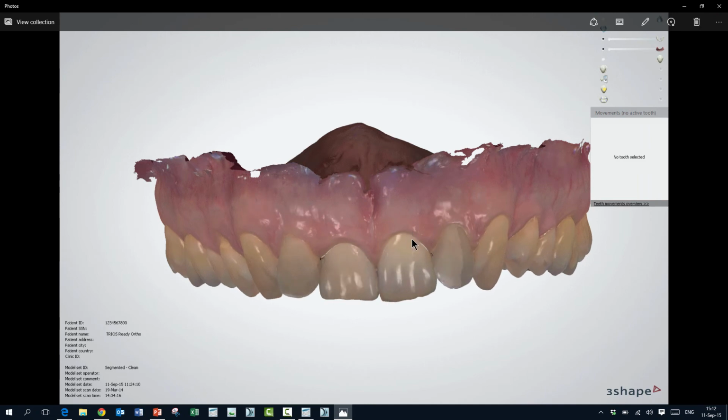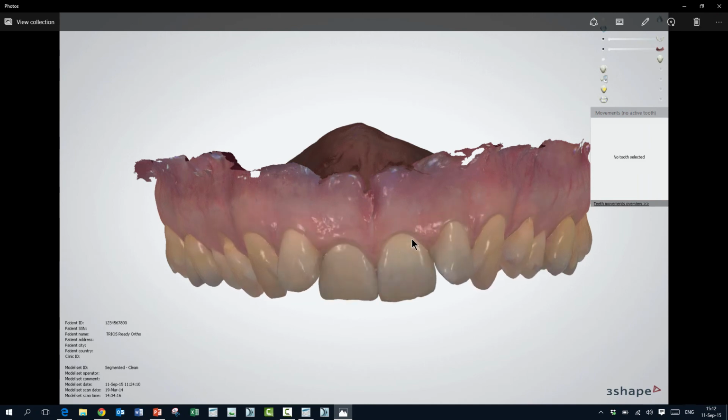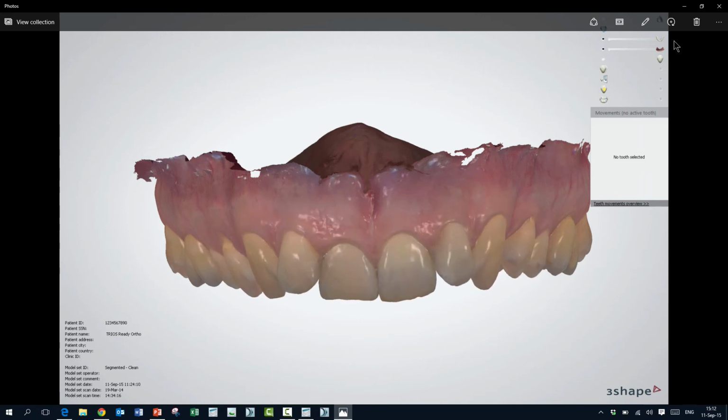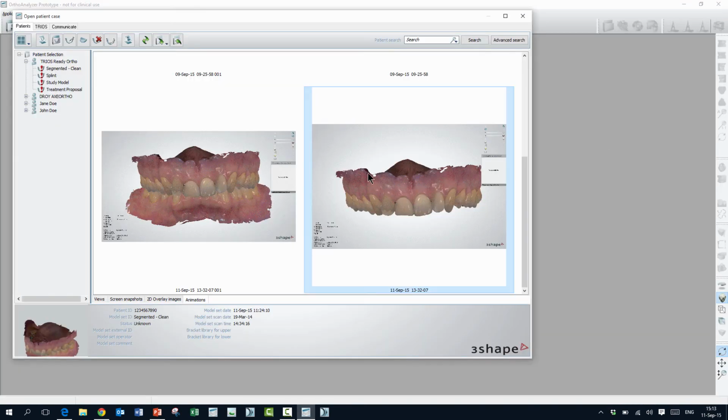And by the way, as you can see, like a lot of GIF files out there, this is on continuous loop. So when you want to show some of this to your patient, you don't have to worry about whether you have time to show it or not. It will simply go on an indefinite loop here. Let me close the file again. So a few more things I want to show you here: when you right click the file, you have an option to choose another program to open it with, or you can use save as, and then you will be able to save that GIF file on your local PC.